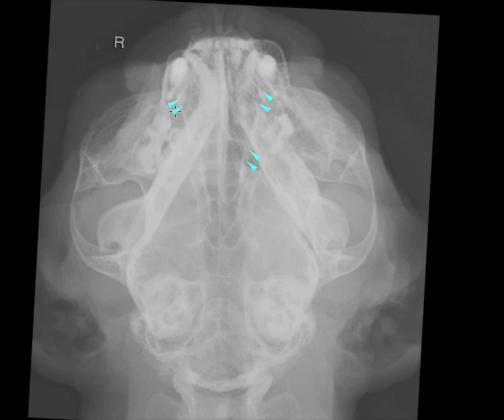The next thing I want to think about, and I have essentially the same thought process, is in addition to that difference in opacity, one could also say that we observe lucency in this region, and especially what I notice is that when I trace the right mandible, I can trace it really well, and when I trace the left mandible, I start to lose it about here, where I've put the arrow.